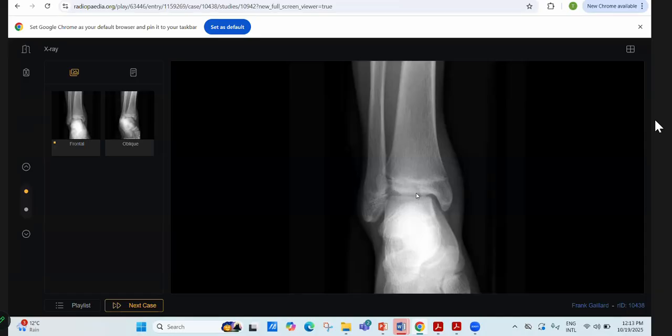So I would like to know if there is any history of fall or trauma. Yes, there is a history of trauma. I would like to raise the concern with the primary team and request them to further go ahead with a CT of this area to rule out any underlying fracture. And it is not crossing through the physeal line. It is within the epiphysis.